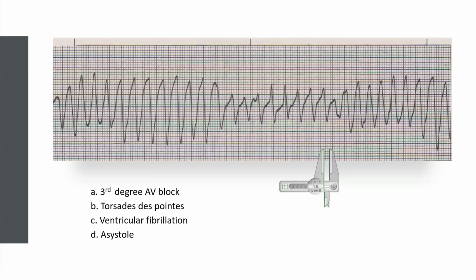So if you take a look at the points right over here, it is twisted and it looks like a party streamer actually.